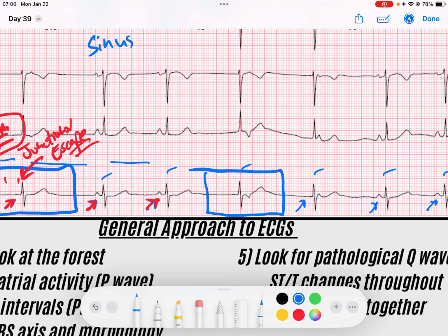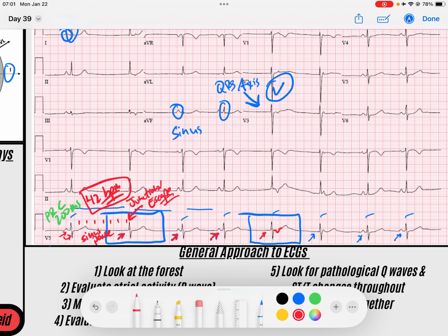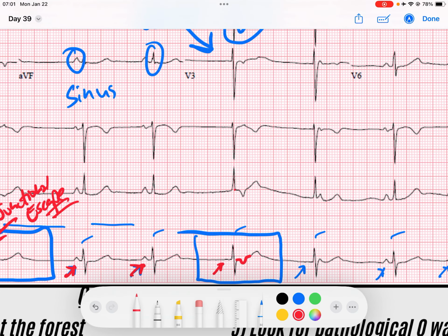And the big difference that you'll notice is, one, we still have our narrow QRS. I still see no P waves. But what I do see after the QRS is this retrograde P wave. And I know that that's a retrograde P wave because if I look up in my inferior leads, you can see lead 2, which is this strip right above it. Right after the QRS, I get this sharp dip. And remember that sharp is associated with P's. And so you see that there's a superimposed retrograde P wave on top of the T wave.